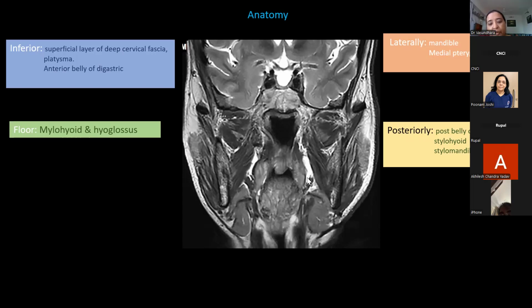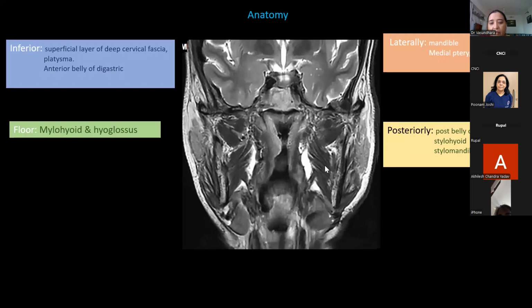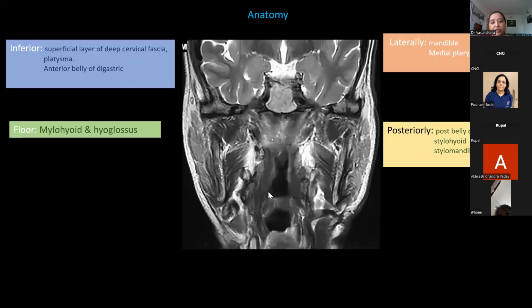This muscle is also important because there are nerves over here, the lingual and the hypoglossal nerve. So enhancement medial to this muscle, I look for any enhancement to check the perineural because these nerves per se are not easily seen. So perineural going beyond the tongue, I take this as a landmark to understand that. You will see them very clearly in all the patients, the styloglossus.